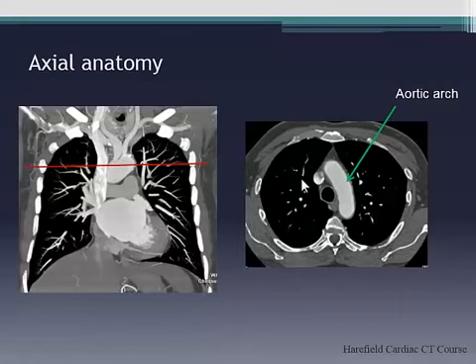In the same way, your most posterior cardiac structure should always be your left atrium, yeah? Think about it. The left atrium abuts the esophagus. For those of you who see EP procedures, esophageal injury is one of the worries of our EP colleagues, because it's slap bang against it. The other golden rule is to remember the structures that drain into the right atrium, which are going to be SVC, IVC, and coronary sinus. Okay? So you just have to learn, unfortunately, a few of the basic anatomy bits. But it's quite useful to learn these golden rules, because it will get you out of trouble if you're not quite sure what's going on.